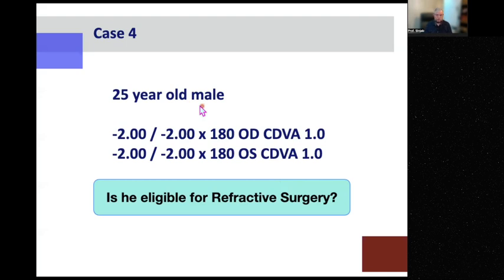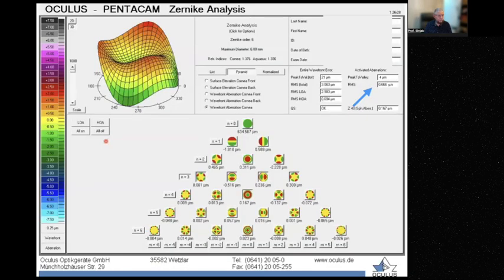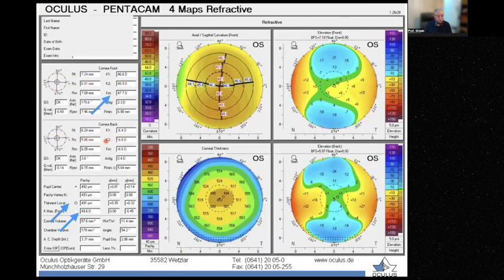Avoid corneal procedures. Super. So let's see if we can, because 25, maybe we can do phakic IOL. All right. So for phakic IOL, we have to go to here, the parameters. Here, anterior chamber depth and anterior chamber angle. The depth should be at least 3 millimeter internally.